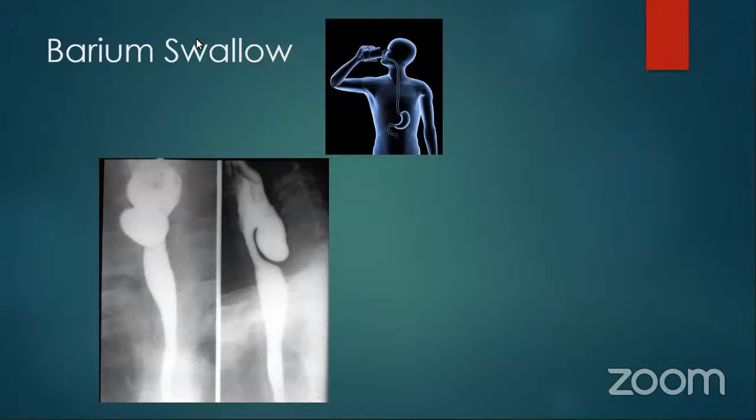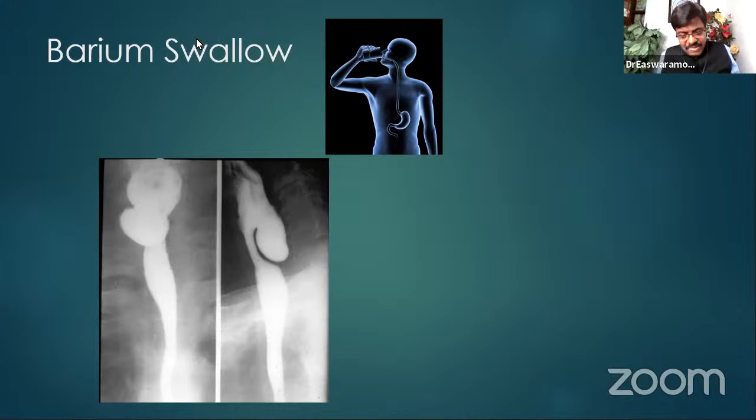Zenker's diverticulum, sir. Well done. So this is actually a Zenker's diverticulum. Zenker's diverticulum is due to what? It is a classical description. Is it a true diverticulum or a pseudo diverticulum? First question. What is a true diverticulum? What is a pseudo diverticulum?